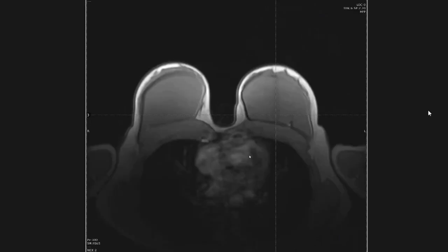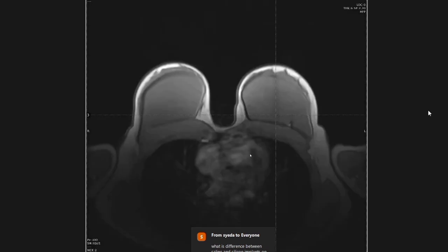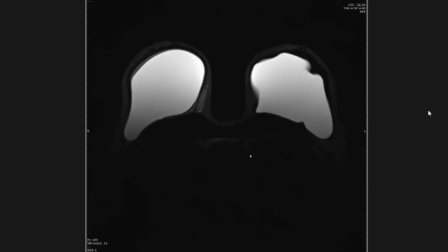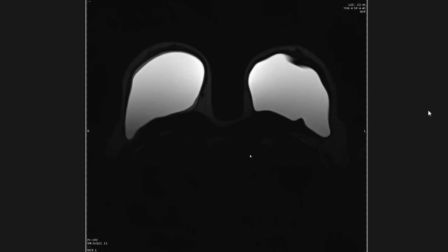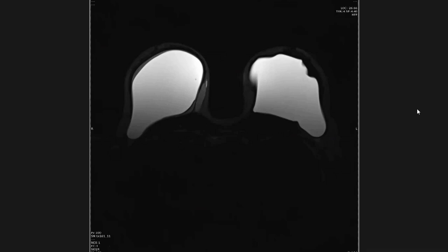It is quite irregular in shape, extending up to the axillary region, and more irregularity evident along its inferior margins. Some keyhole. Yes, now in this section, I can see hypointense strips in the silicone implant. Yeah. Now the capsular irregularity of the silicone implants is more evident in this view on the left side.